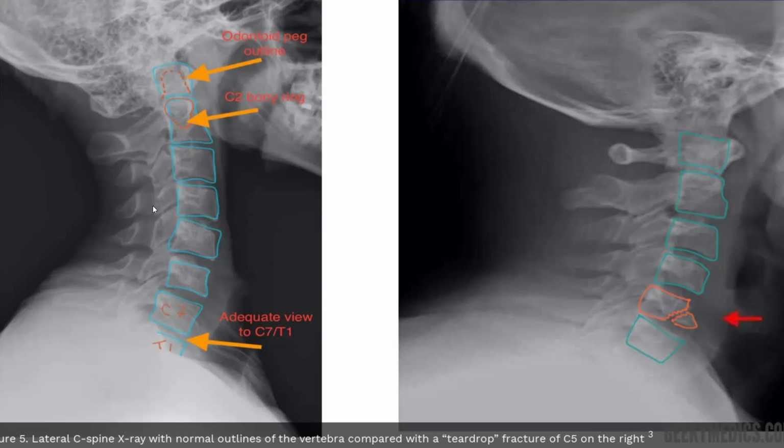Regarding the line, it is smooth. So here it's good alignment also. Here, what is this fracture? So this is which fracture, sir? Teardrop fracture.